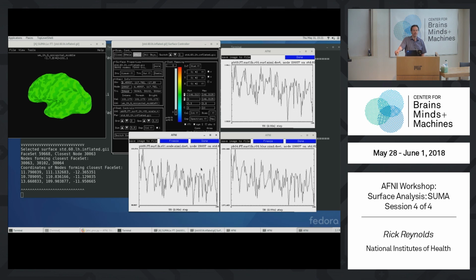They may be, the binary float may be converted to a text format in the NIML file. Actually, that depends. But anyway, they're floats. So in this case, you see very tiny truncation artifacts. They're just identical, except on the right I see the values are around 1,200. On the left, they're around 100. So essentially, you're dividing every value by 12 or so.